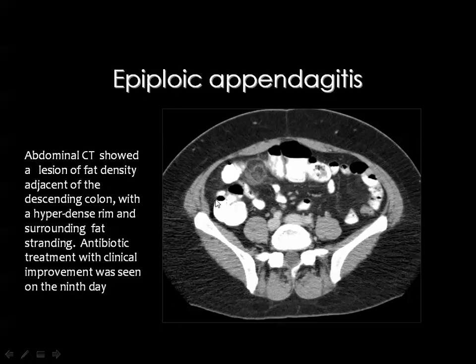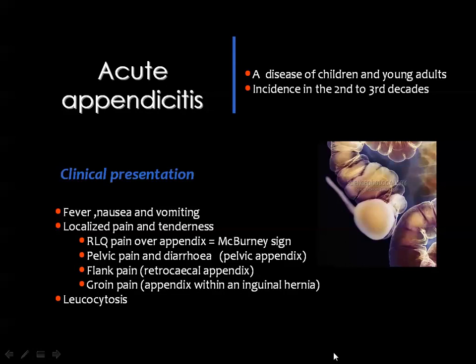This is another example, and I have to say that diagnosis of appendages epiploica is difficult, and is usually the diagnosis of exclusion. Whenever you look at a patient with acute abdomen, searching for diverticulitis, appendicitis, cholecystitis, and so on, and you did not find any signs of these, you may think of epiploic appendicitis, looking for this classic lesion, you may succeed to find one of these lesions.